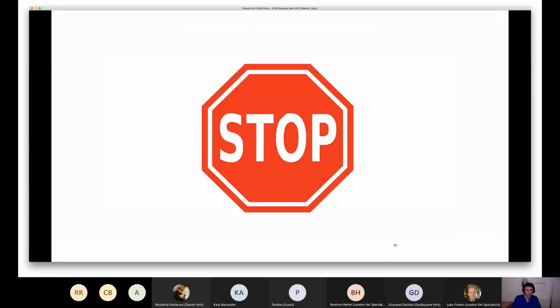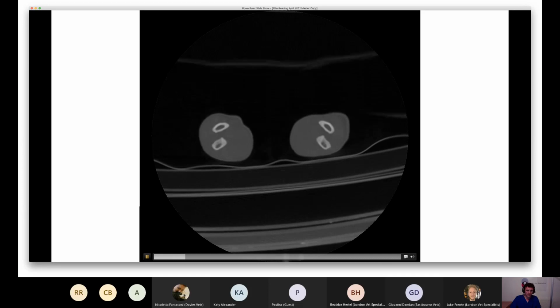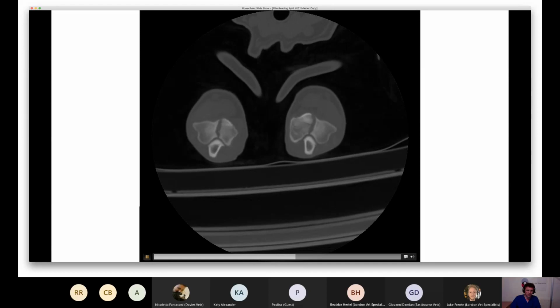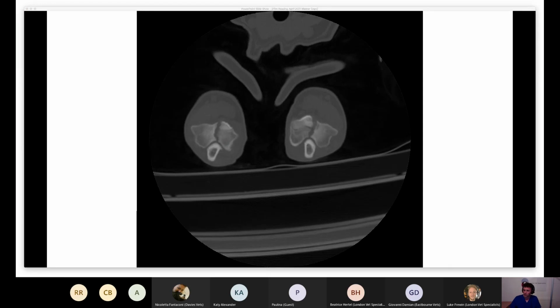So in order to convince you guys still further, we can take a look at a CT scan of this patient. So let's just run through this. This is a 0.6 millimeter bone reconstruction of this little doggie's elbows. So just moving caudally towards the elbows, and here we have the elbows, and I'll just pause it there. So hopefully you guys can appreciate that there are indeed two really large sagittal fissures bisecting both the left and the right humeral condyle, and they absolutely shouldn't be there. So this dog does indeed have incomplete ossification of the humeral condyles.